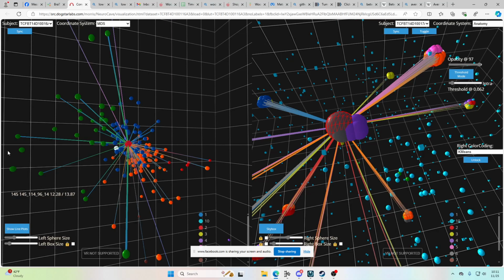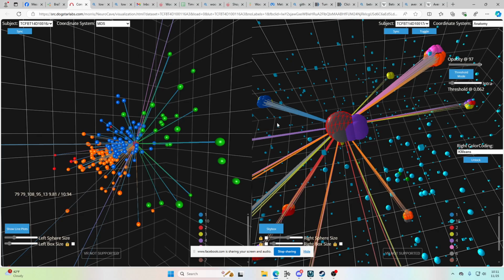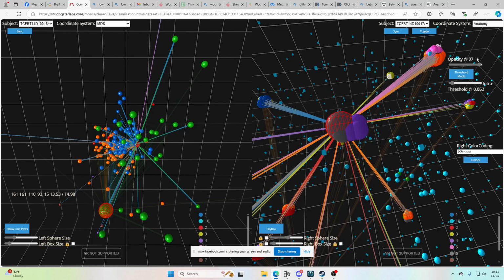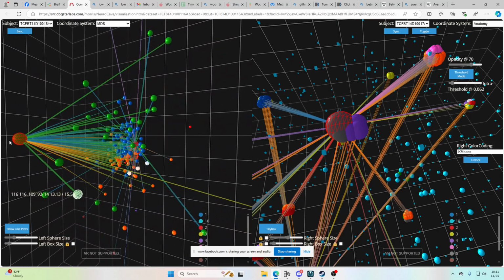So you can really get an idea of the graph theory that determines the different centralities. You can build a graph: click on one of the neighbors and get an idea of what the neighbor's connected to.